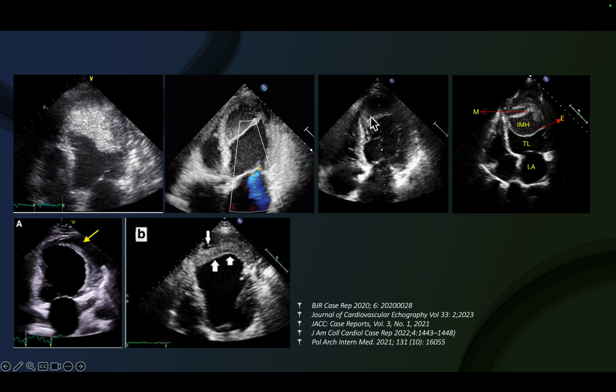Again, a liquefying thrombus here. Then the layers of various organization of the thrombus. This is again hematoma with liquefaction at the other end, and this is a kind of organized thrombi inside the intramyocardial dissecting hematoma.